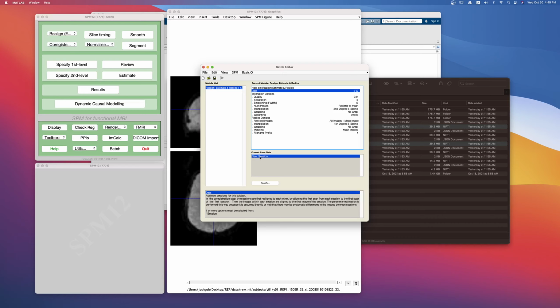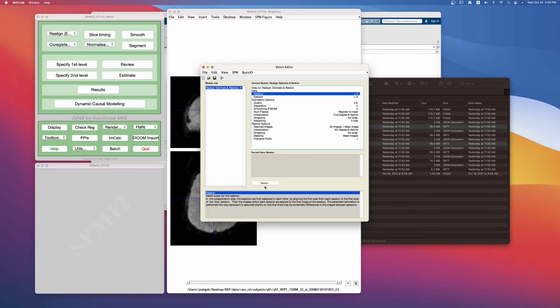So here at the bottom, we're going to tell SPM, in the data field, to create 2 sessions. If you click it once, you'll see that this session appears with a new X here. And we have 2 sessions, so we're going to have another new session. Click it again, and then there'll be 2 sessions with 2 X's. And here's where, if you go ahead and click the session, it will ask you to specify the data that you want to enter into the session.